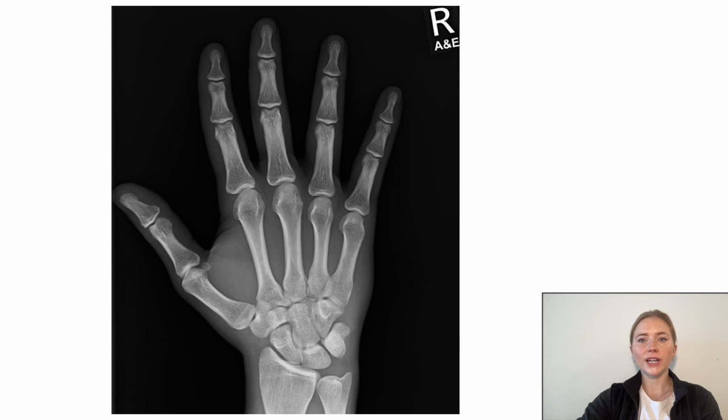While X-rays are best for diagnosing bony pathology, there may be clues on X-ray that can indicate soft tissue injury. Normally, you should see a soft tissue contour that is mostly uniform, except in areas that may have skin folds, such as in the thenar area here. This is an example of a normal hand X-ray. In settings of hand injury, you may sometimes see clues of soft tissue involvement, such as with swelling, discontinuity, or collections.